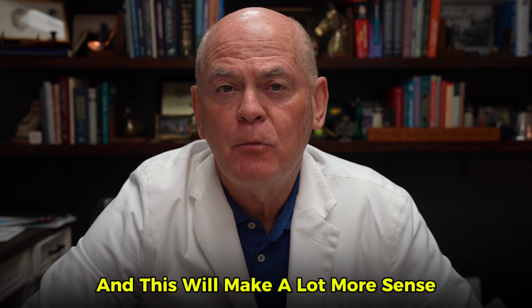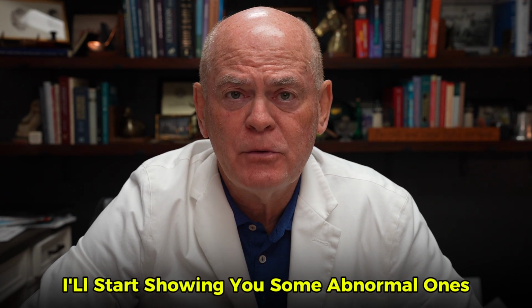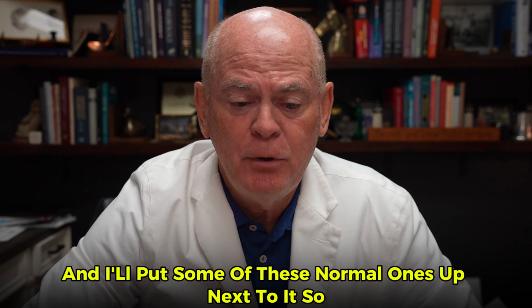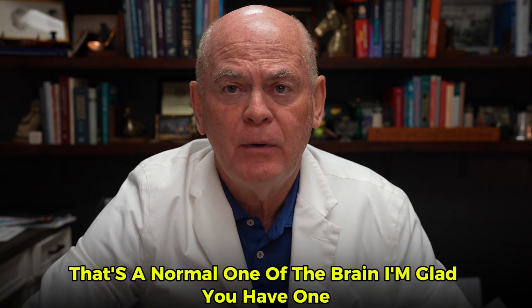And this will make a lot more sense when I start showing you some abnormal ones. So the next one I'm going to do is on cerebral vascular disease. And I'll put some of these normal ones up next to it. So that's a normal MRI of the brain.